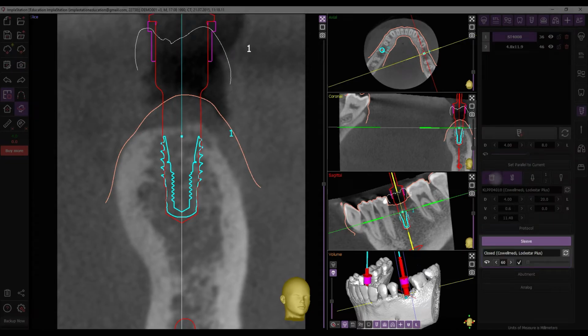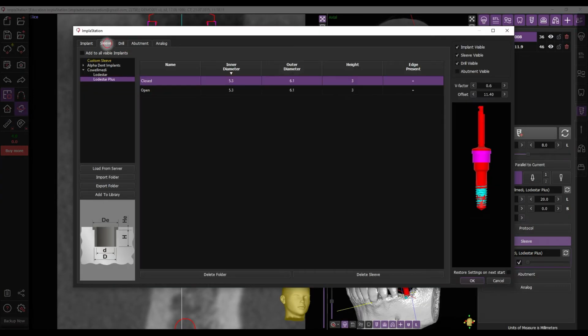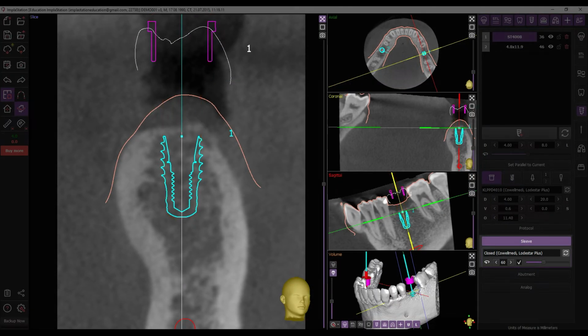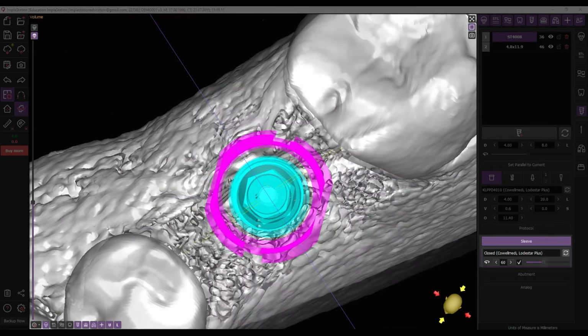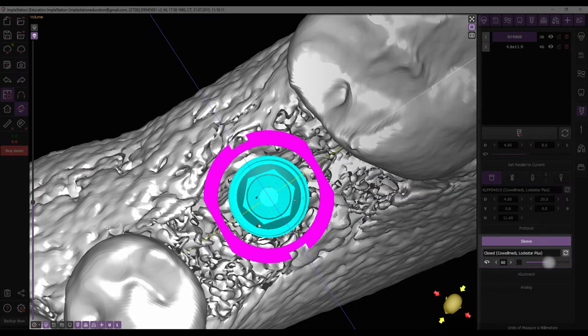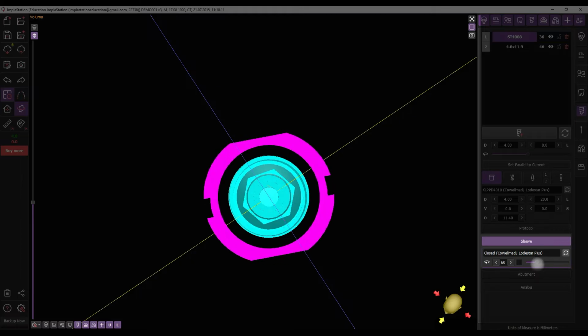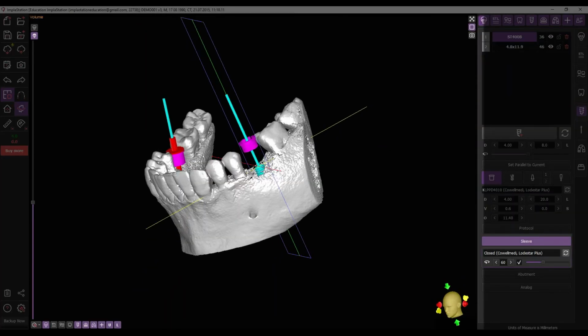The window displays the name of the installed sleeve, and there is a button nearby to replace it. If needed, you can also change the sleeve through the Implant Replace menu. Following is the slider for rotating the guide sleeve. Rotation takes place at a designated number of degrees and is relative to the implant's hex. There's also a checkbox here to link the sleeve to the implant. If unchecked, the guide sleeve's rotational position becomes independent. We advise keeping this checkbox active.